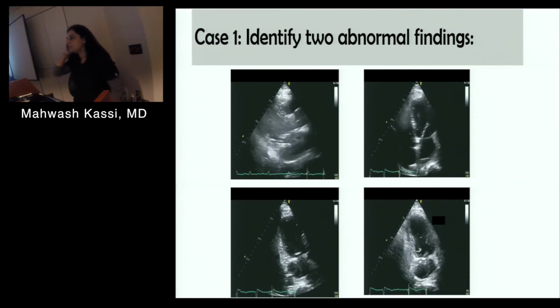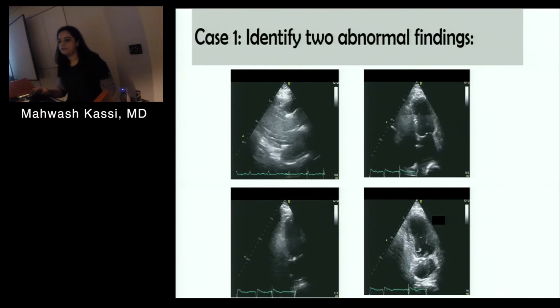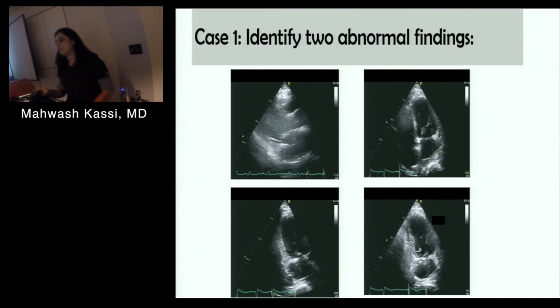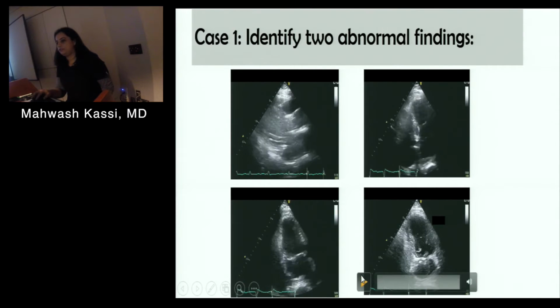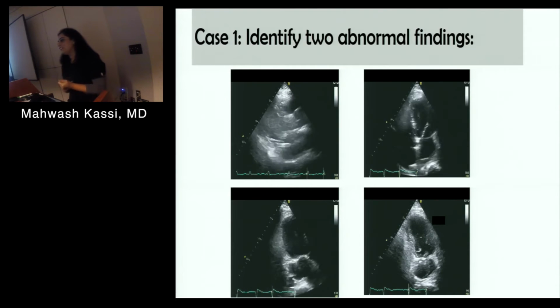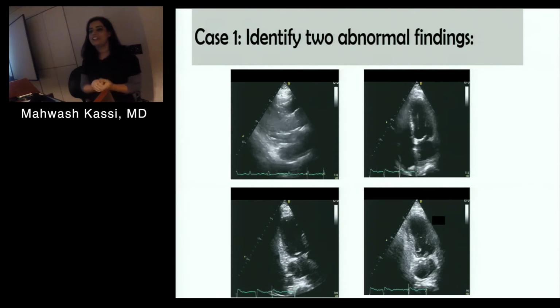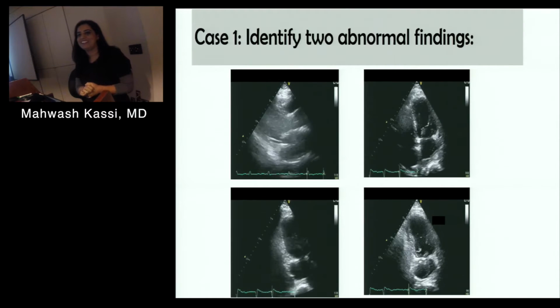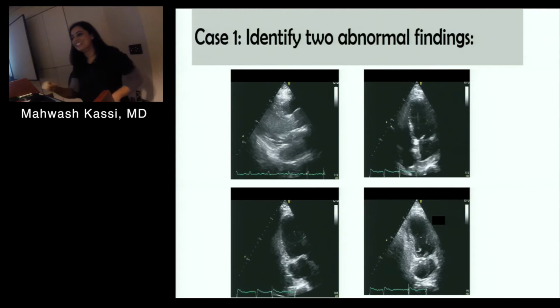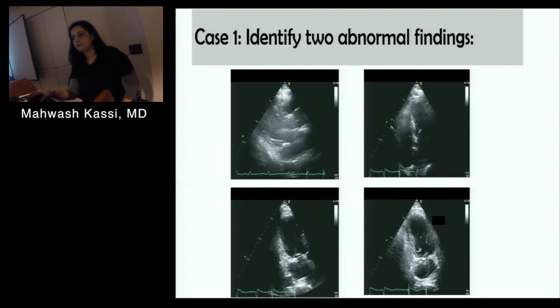So I'm going to leave this on for a minute. Anything? Any comments? Bashar? Santi, Bashar, John, Jeff? Okay. Well, we all know. Yeah. I don't know, there's something popping in and out of the apex. I can't tell on the upper right.